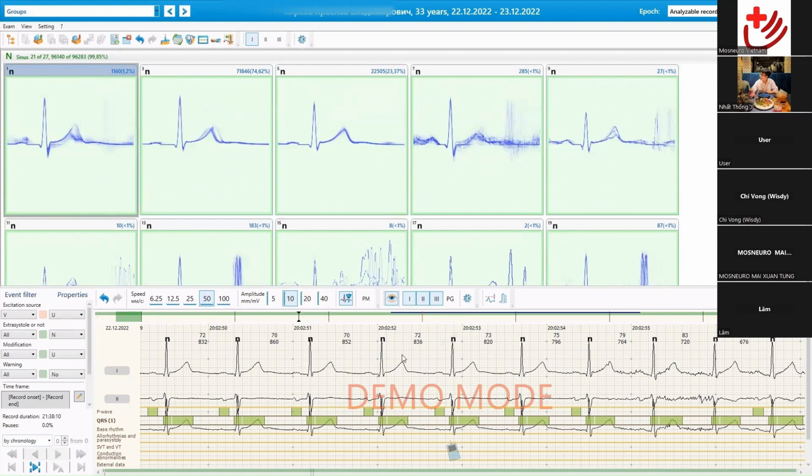When I speak about editing, you can say, okay, Dr. Fomin, that's a crazy thing to perform some editing because we have 100,000 QRS complexes and no one wants to spend hours going one by one and checking what's happening, if something is wrong. So for this purpose, we have a tool that works with groups of similar complexes.